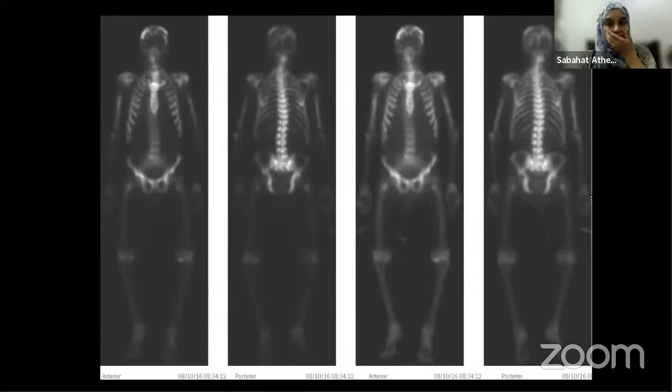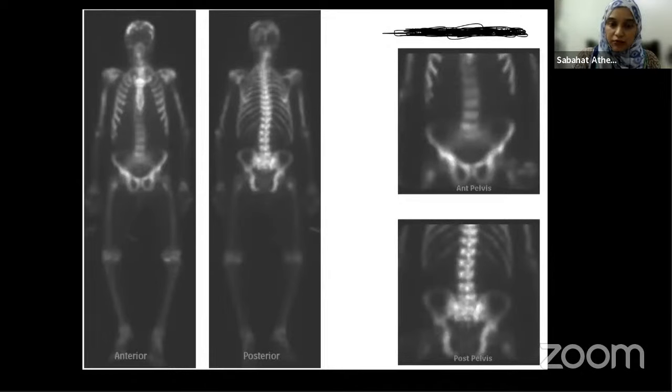Okay, marching on. So what is happening here? I'll wait, I'll give some time. I think there is some lag for the chat. So I will give some time for the candidates to see this case and tell me what you think.